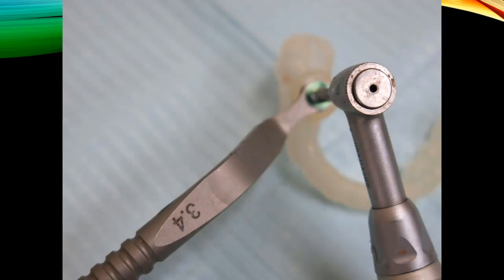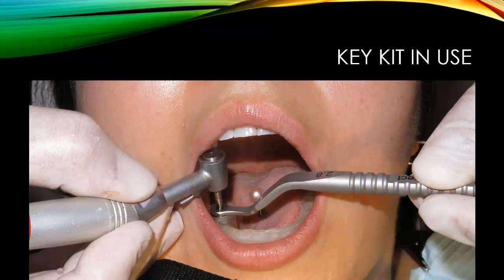Here's all three of those pieces together. So you have your osteotomy drill. It's not in perfect focus here. You've got your instrument, key, and you've got your guide. So all three pieces are fit for demonstration purposes here.